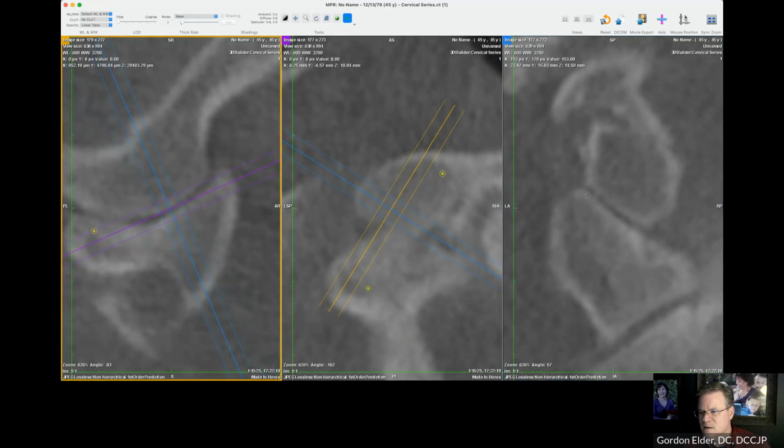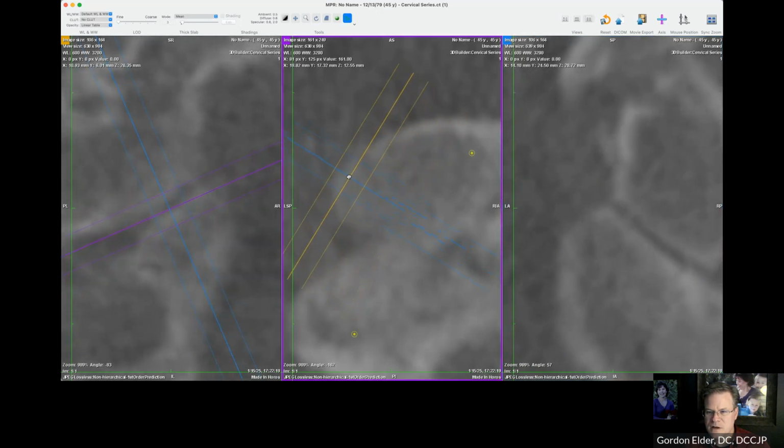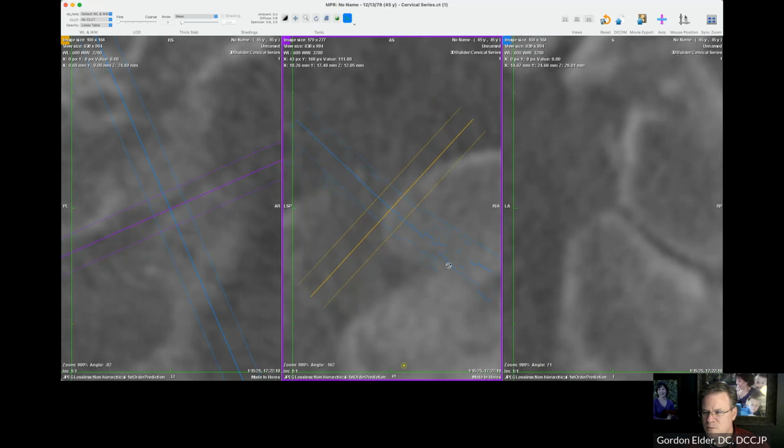Tangential to that line. I'm going to say this outside margin, the joint surface seems to end right there, and the joint surface seems a fairly clear corner here. Sometimes we'll find that things are rounded off a bit. It's harder to see, and sometimes you have to take a more general view, which would be like the 20mm one. But it looks like it's level. Let's go out here and just rotate a little bit.